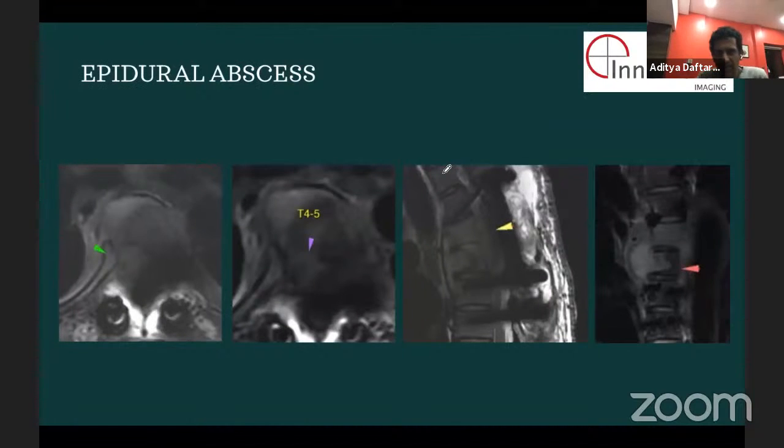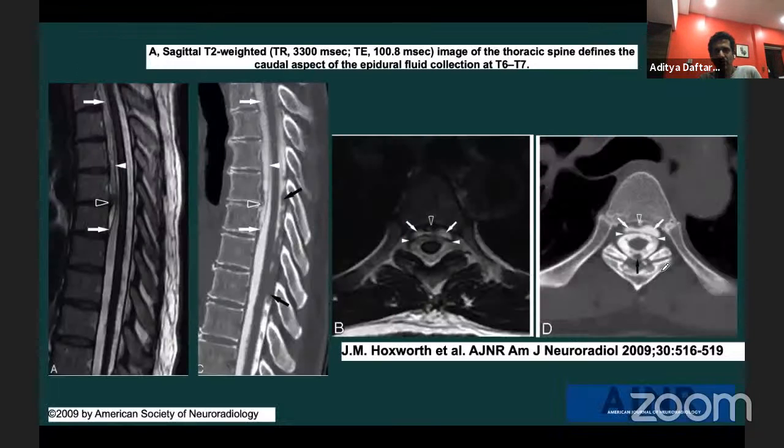And then here again is another example of a large epidural collection and epidural abscesses. So these are the other things you'll see. This is out of the literature, because we don't see as many of those, or we don't actually have to image as many of those, when you're looking at CSF leaks. Here you can do an intrathecal injection of contrast, and when you see leakage of contrast into the epidural space here, then you know this is somebody who's got a CSF leak. And oftentimes you can look very carefully and actually find the point of the leak when you do these studies.